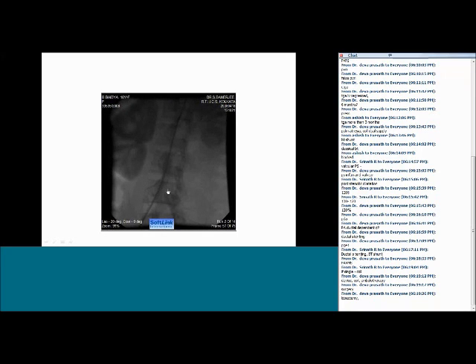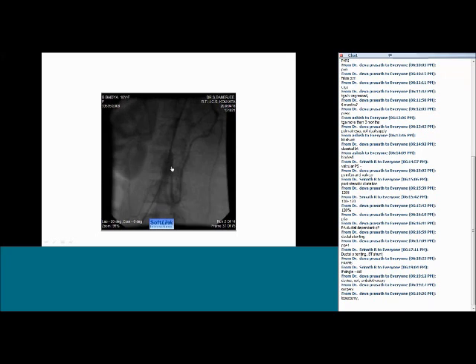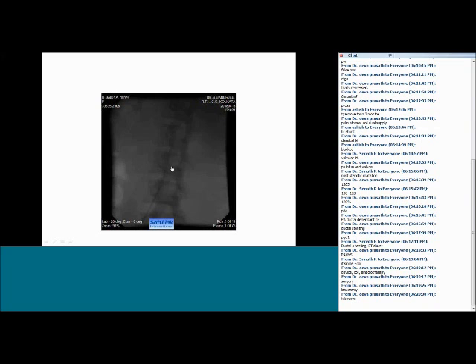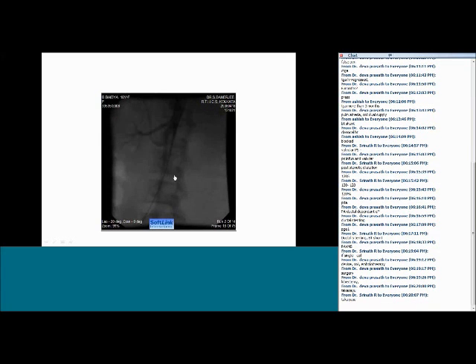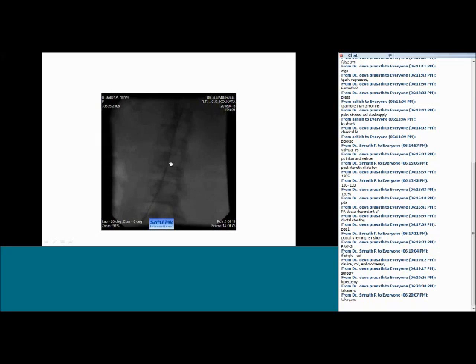Okay, diagnosis: 18 years old girl with severe MR, being followed up as rheumatic mitral regurgitation. Correct, that's absolutely correct. Takayasu disease. Very sad part is this patient was being followed up as rheumatic mitral valve disease and was posted for a mitral valve replacement.